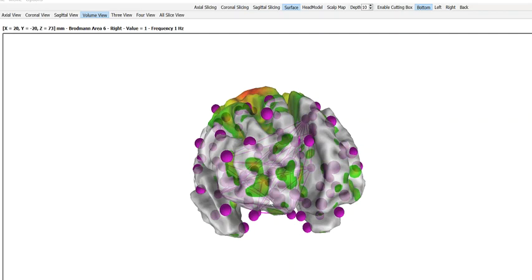This is a view of an early development of our connectivity in the NeuroNavigator with swLORETA. What you see here is the MRI from the surface, and the spheres are the center voxels, really surrounding the center voxels of 88 Brodmann areas. Even though these are single voxels, because it's low resolution electromagnetic tomography, the spheres basically look at the extent and a centimeter or so of sources, and we can change the size of spheres.